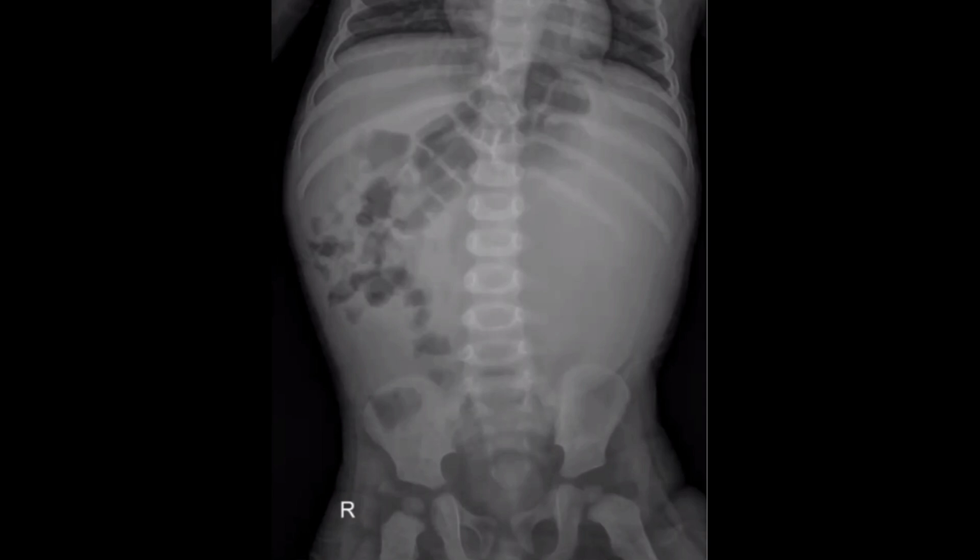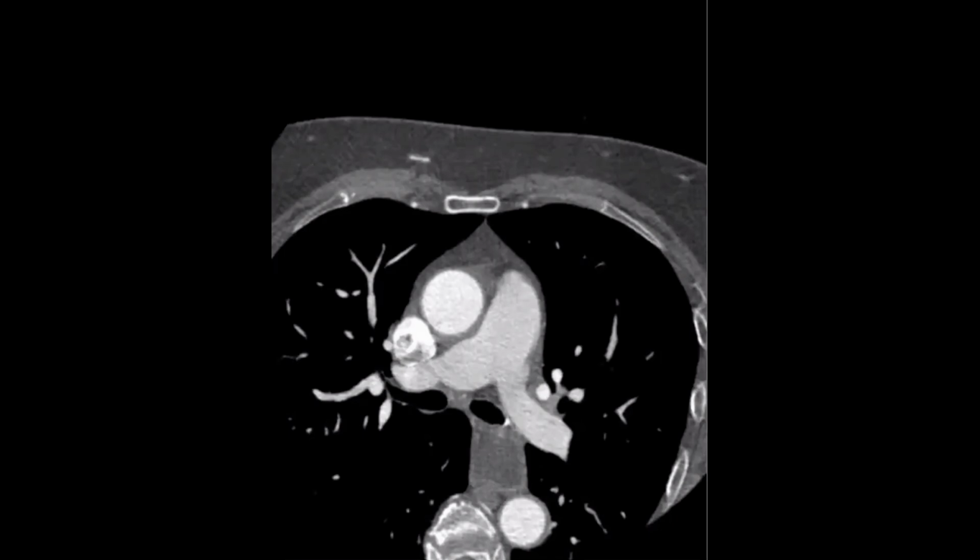So we should localize the kidney and suprarenal glands. Also maybe multicystic dysplastic kidney, but this one would not reach such a huge size of soft tissue lesion. So those are the main differential diagnoses. As we said, the next step is CT abdomen and pelvis.